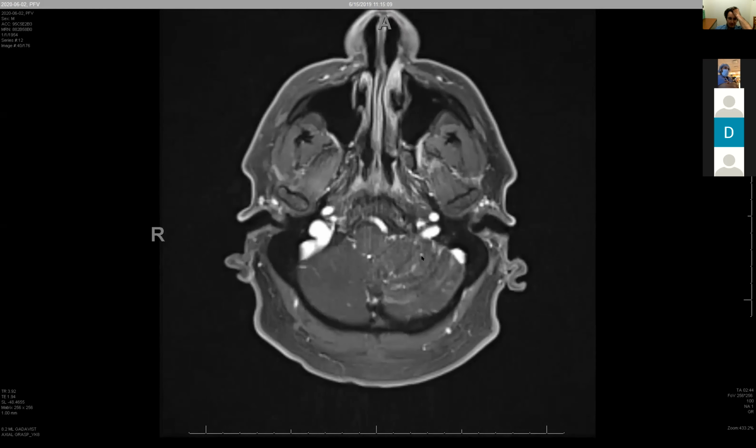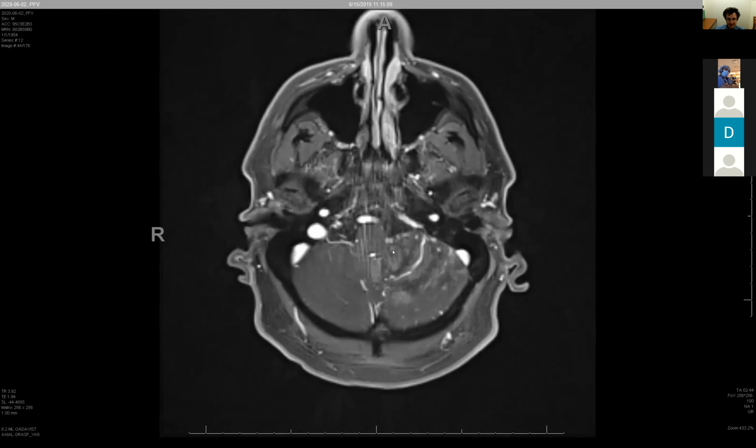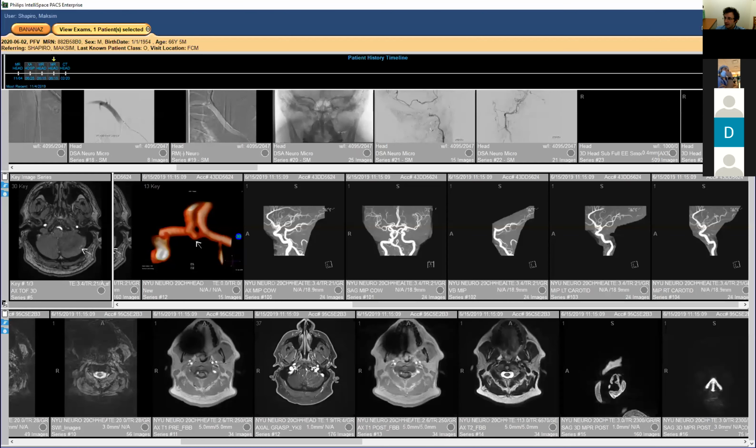We didn't cover it, but there's a great case we could show of the homology of the venous system of the brainstem to the spine. You see all these transmedullary veins, the transmedullary veins of the supratentorial system. I think this is on the spectrum of that. When you look at the transcerebellar, it then drains toward the petrosal vein.